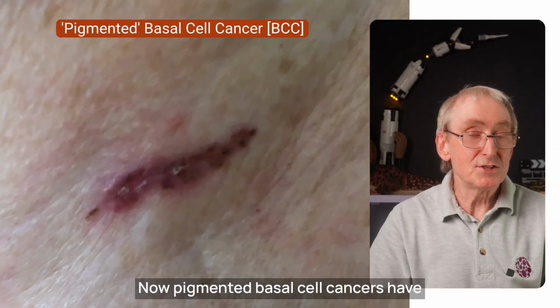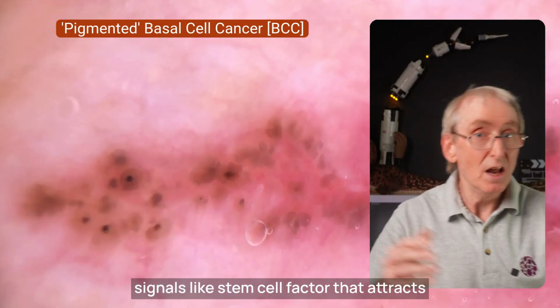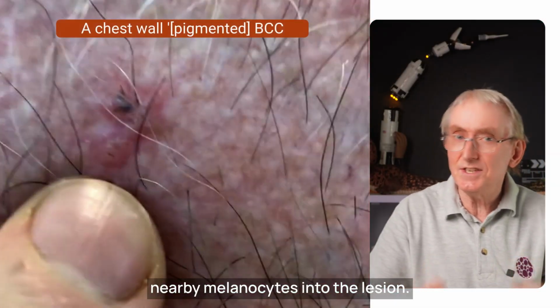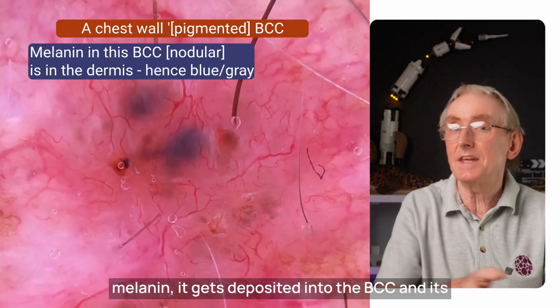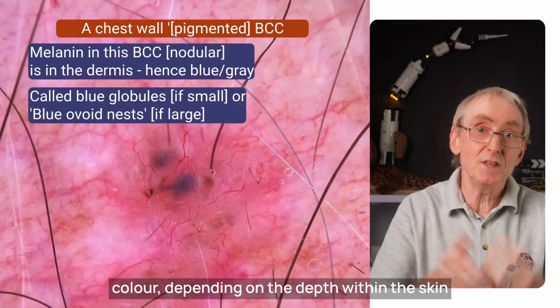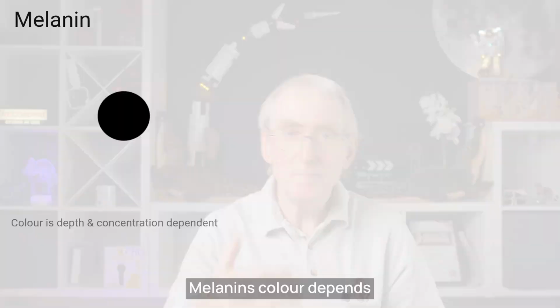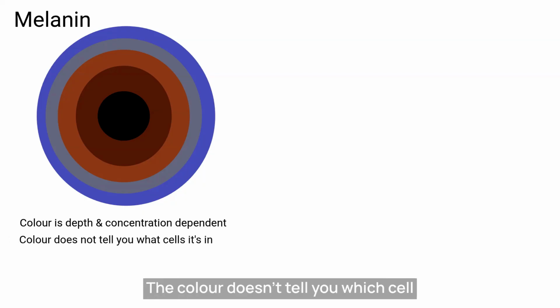Now, pigmented basal cell cancers have melanin because the BCCs release chemical signals like stem cell factor that attracts nearby melanocytes into the lesion. Once inside, these melanocytes produce melanin that gets deposited into the BCC and its colour depends on the depth within the skin. Here are the key takeaways. Melanin's colour depends on its depth within the skin. The colour doesn't tell you which cell type the melanin is located in, however.